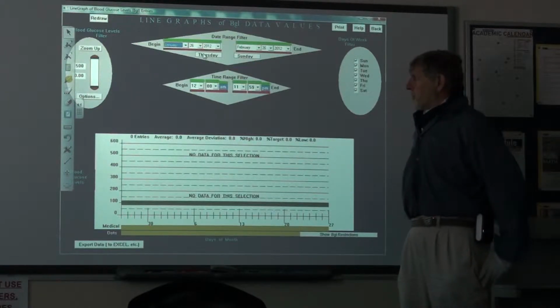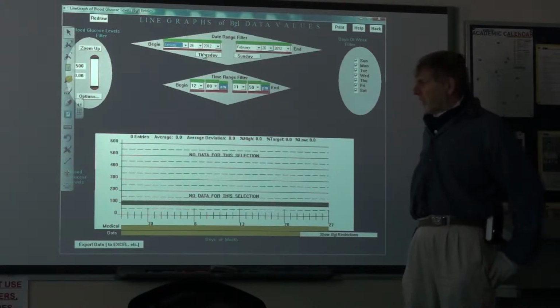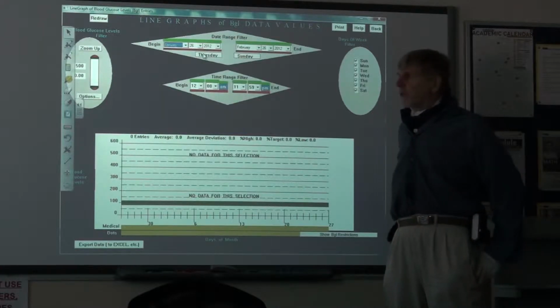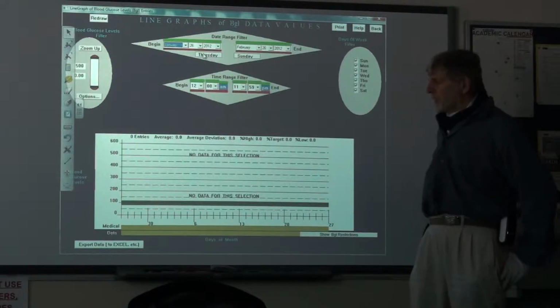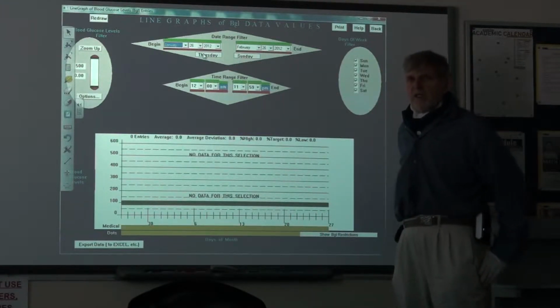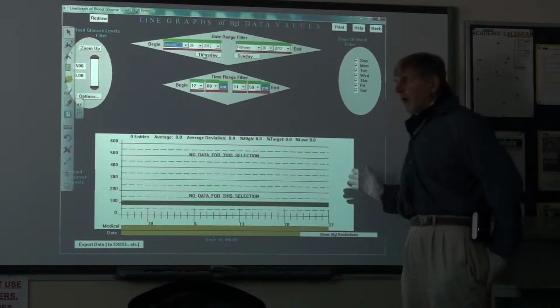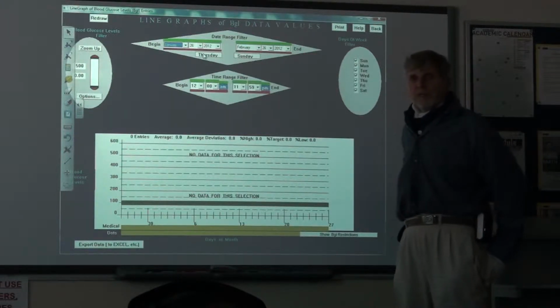As you keep track of your diabetes data, you will also be visiting your physician. And when you visit your physician, with another menu selection in Level, you will record what transpired during that visit. That data will be stored, and it will be accessible to you as a dot on this timeline called the medical dots, and by clicking on it, that entry will pop up as a message box. Thus you can see what happened before and what happened after you made that visit to your physician, where perhaps he changed the amount of medication.